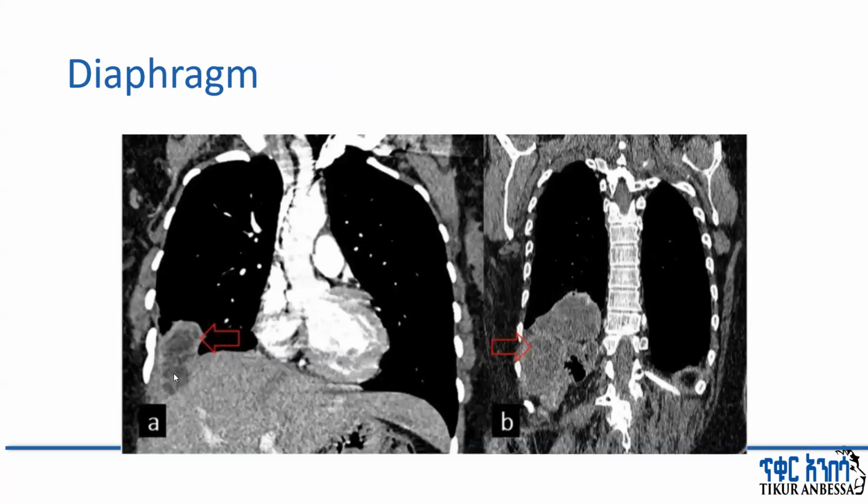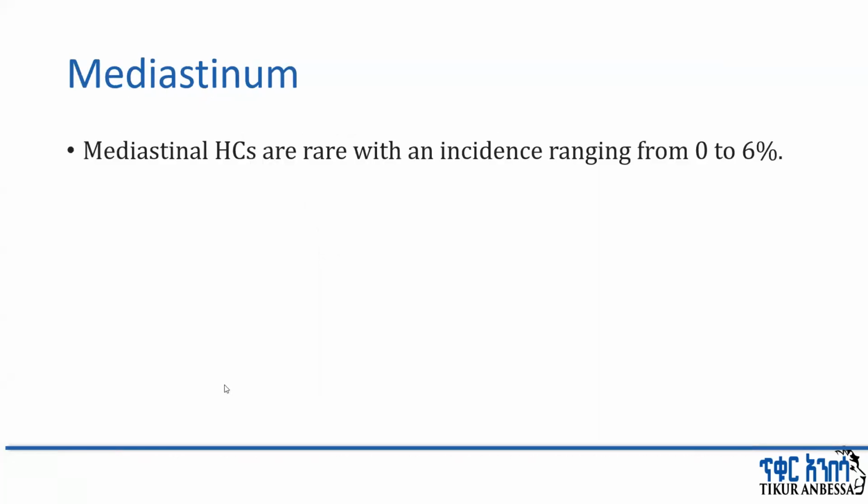So let's see some of the pictures in which the patient has no liver lesion, but there is a hypodense, rim enhancing, membranous mass on the right border of the hemidiaphragm, in which the diaphragm has been injured, and there is a mass in the paradiaphragmatic area. This is a proven case of hydatid of the diaphragm. Another patient, not the same patient, you can see huge cysts in the right hemidiaphragm, and it is a proven case of hydatid cyst of the diaphragm.